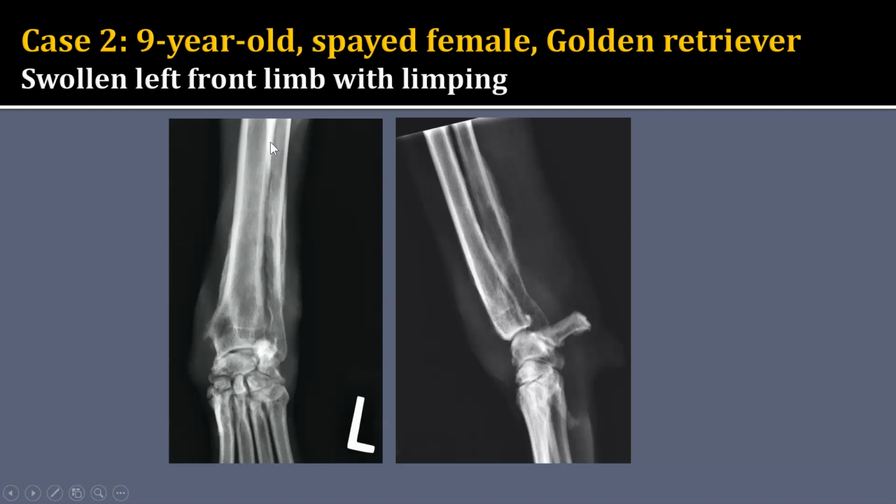So now looking at the bones, let's start with the radius. There is this kind of solid, slightly irregular periosteal reaction on the medial cortex with a more kind of exostosis or extra periosteal proliferation down here distally. In this area, I also see what looks like a geographic to moth-eaten region of lysis. In the more lateral part of the radius, it also looks like there is some potential lysis as well.